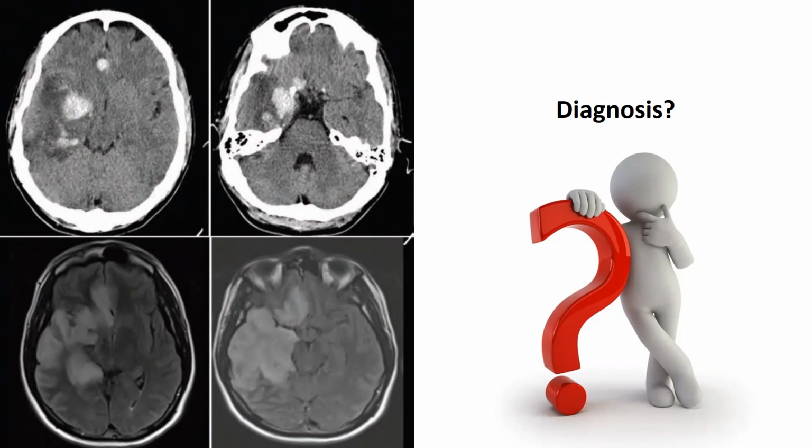So the diagnosis is quite obvious. What is the diagnosis? Sir, there is an acute history of fever, altered sensorium, and seizures, and temporal involvement is predominant. So infective, like herpes simplex encephalitis. Okay. If it is herpes encephalitis, which herpes virus is it? Is it HSV1 or HSV2? Sir, one is commoner, more possible here than two.